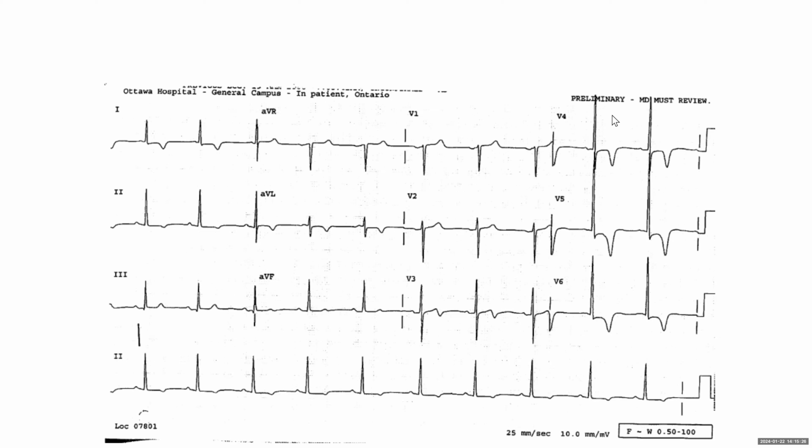In AVR and AVL? Yeah, if you switch AVR and AVL, the P wave should also change. Everything should change. What I meant is that in AVR, if you switched it with AVL, you should have a positive P, and you don't really have a positive P here. He does have an abnormal P wave morphology. It looks biphasic, but it's not negative. So probably not a lead misplacement.